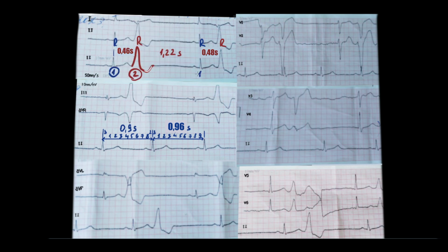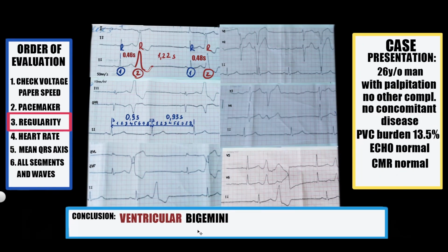Situation when every second complex is ventricular extrasystole is called ventricular bigeminy. This pattern causes palpitation feeling in our patient.